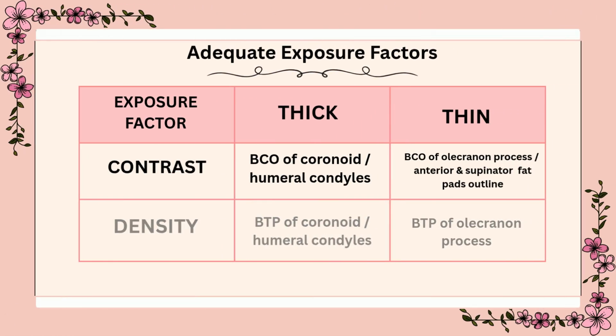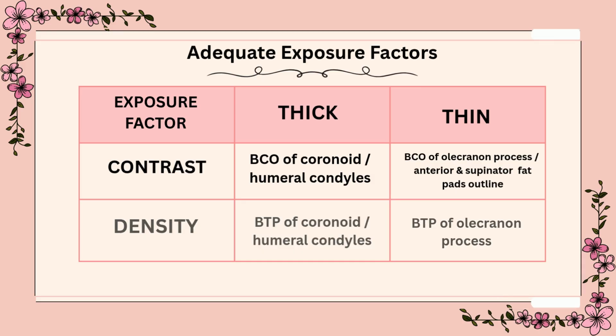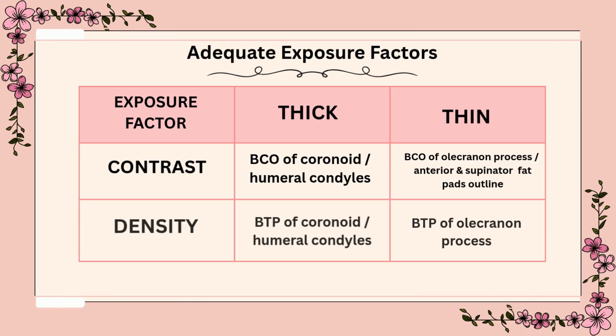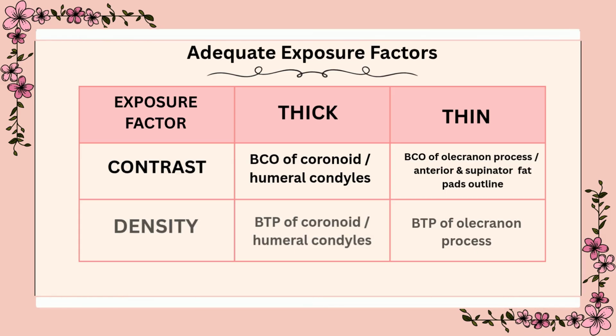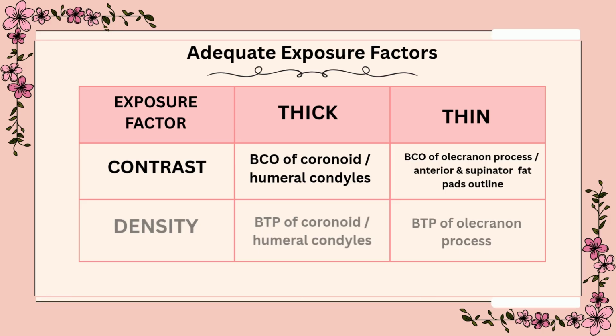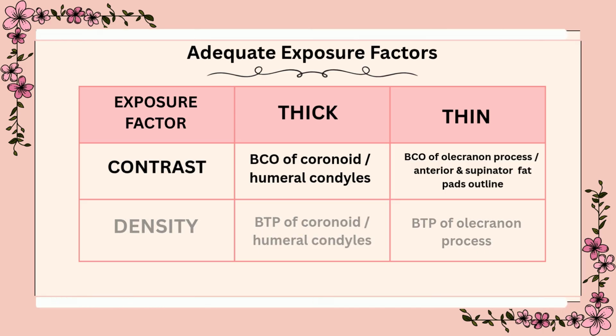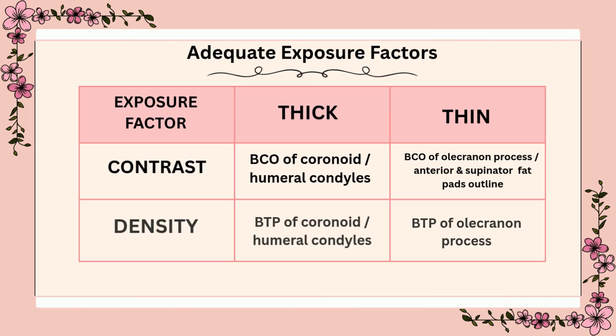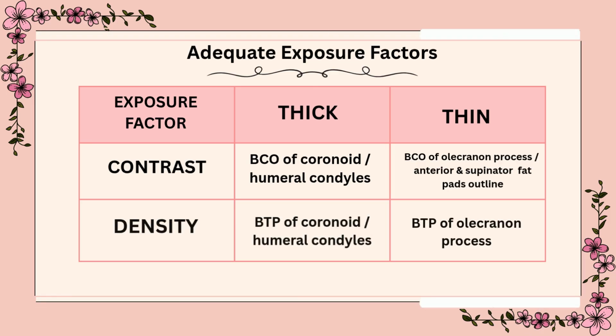On the other hand, the mAs contributes to image density and details. For thick structure, it is important to visualize the bony trabecular pattern of the coronoid or humeral condyle, while for thin structure, we will evaluate the bony trabecular pattern of the olecranon process.